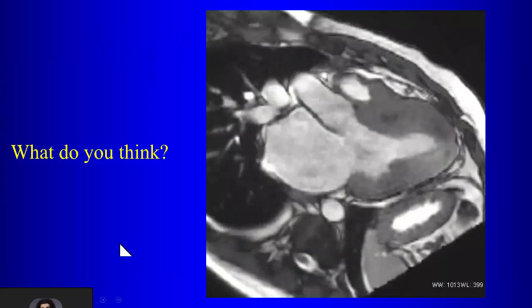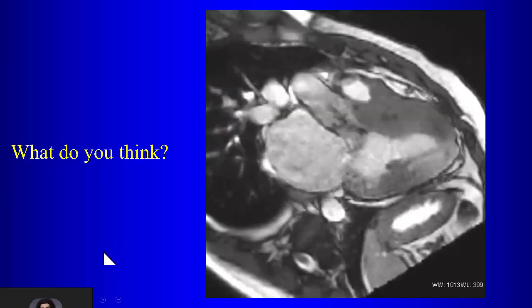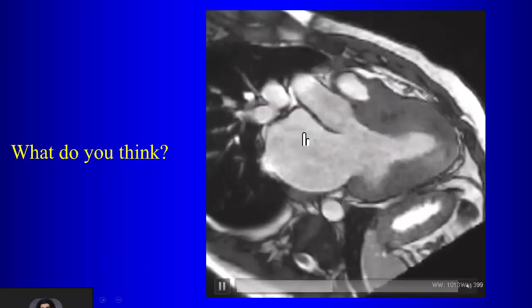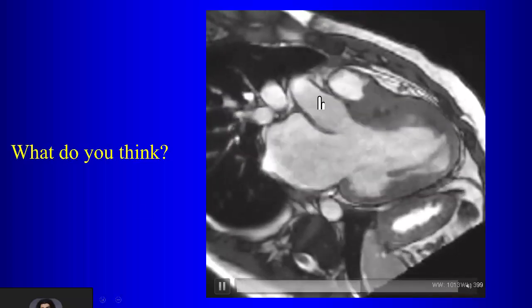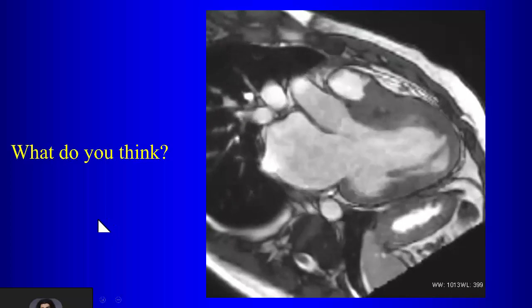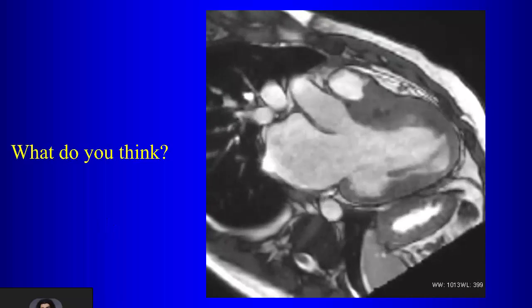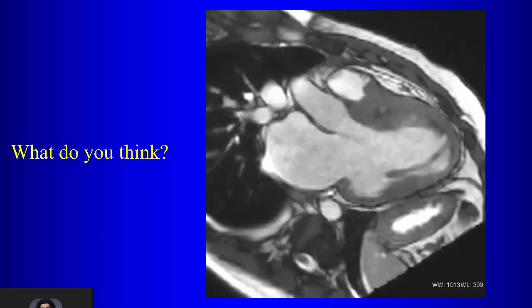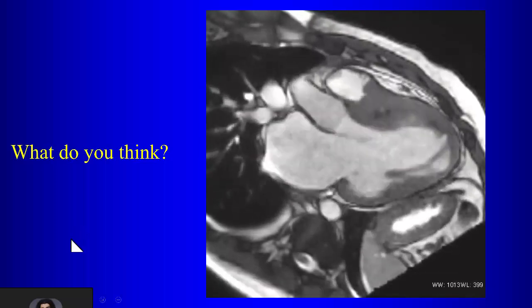Okay. Now, what kind of view is this? Yeah, so it's a left ventricular outflow view, again, also called a three-chamber view. So this chamber is left atrium, left ventricle, aorta. What's wrong here? Is there a flow disturbance? Yes. Where? At the aortic valve, above the aortic valve, or below the aortic valve? So again, it starts below the aortic valve, so you can see the turbulent jet that starts here below the aortic valve, okay? So in this case, what's the cause?